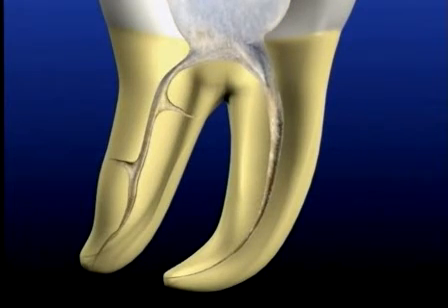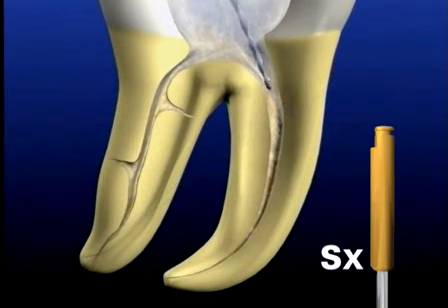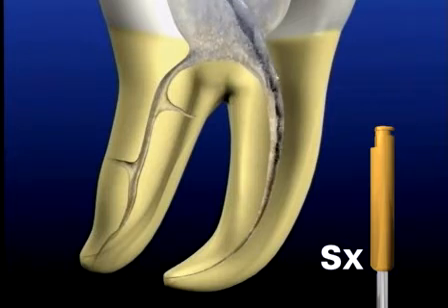Clinicians need to recognize that the reason the handles of the hand files are off axis is because of the internal triangle of Dentin. To remove this, the instrument of choice is Shaper X. It's a 19 at D0 and it has a 19% taper over the first 9 millimeters of its cutting blades. The hero part of this instrument is its middle third. That's where we want to cut on the outstroke.